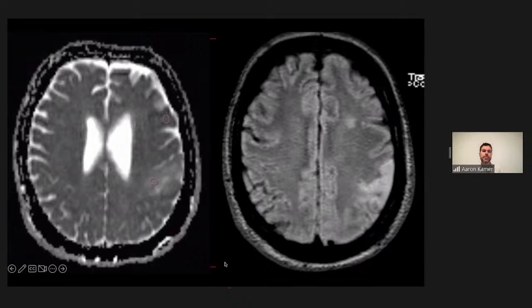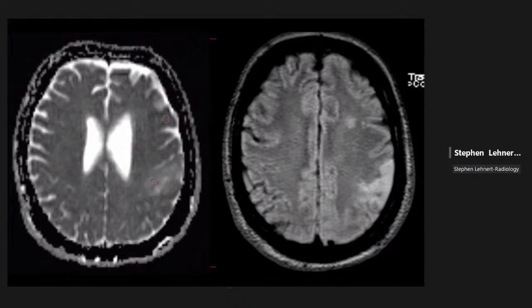So what if I told you that this patient had an MRI that was done a week before this that was totally normal, and then had a seizure, we re-imaged the patient, and these abnormalities showed up? So this could be sequelae of that seizure. So you get gyral thickening from edema. Yes, absolutely. And is the high ADC typical? No. No? So tell me about that. So that means that there's some increased diffusivity of that area.